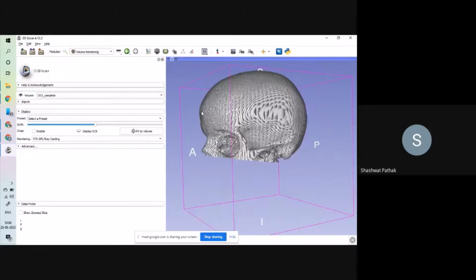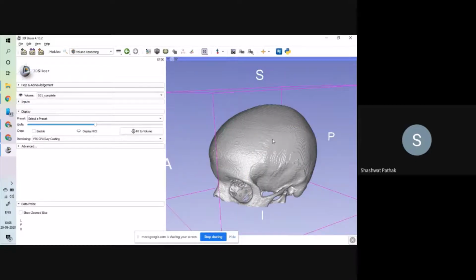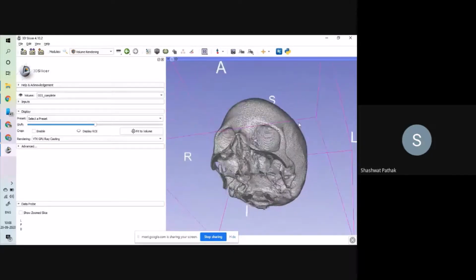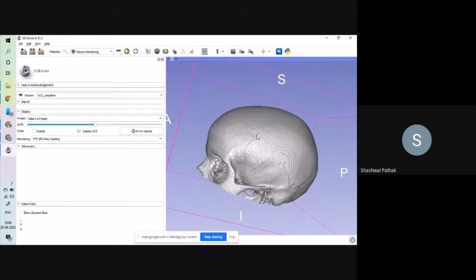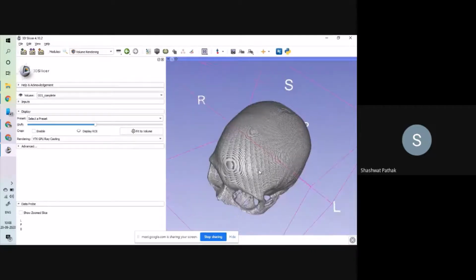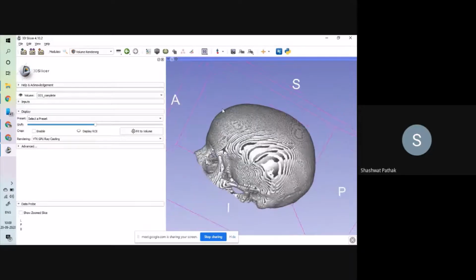And yeah, so as you can see right now, there's this additional utility in Slicer which aligns the data automatically corresponding to its anterior, posterior, and superior, inferior positions. So this attribution is done on its own. So for ease of visualization, I'll center the data that is under observation. So this is basically the mesh that I had stored in the NRRD folder.